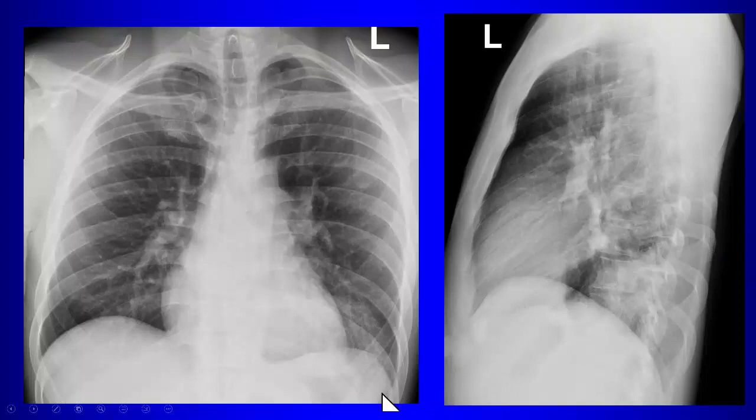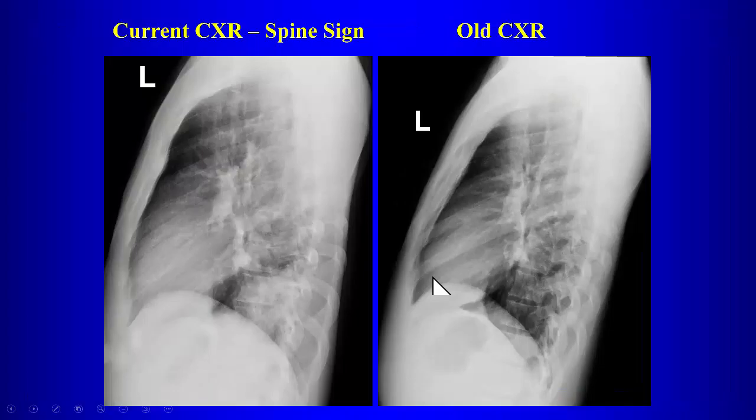This patient has fever and cough. Pneumonia. Where? In the left. Left lower lobe, right. Here, that's the retrocardiac region. You have extra opacity there. Also, it obscures the left diaphragm. Always look for both diaphragms on the lateral view, right? If you can't see one of the diaphragms, think about why. We can see the right, can't see the left. This patient has a left lower lobe pneumonia.